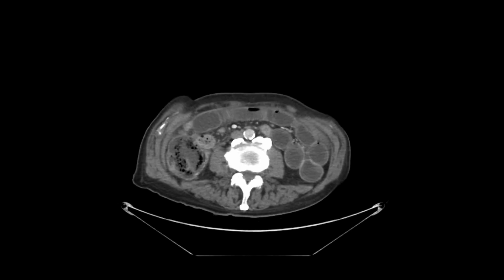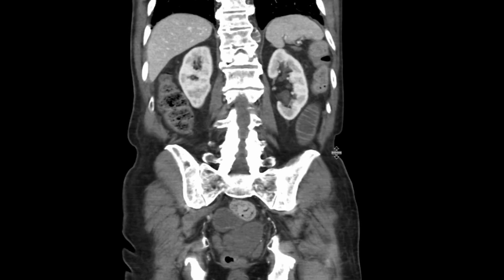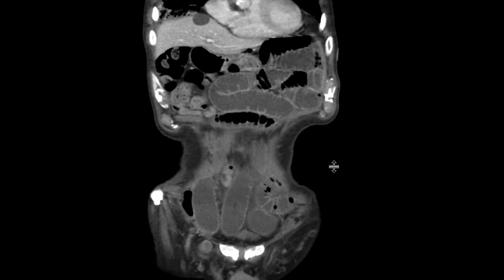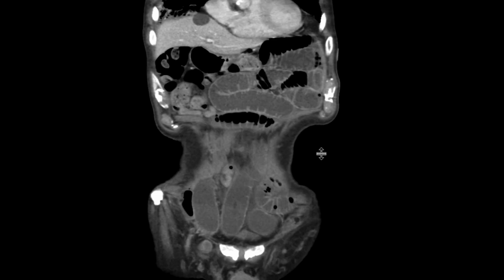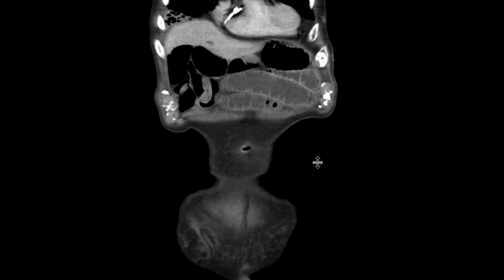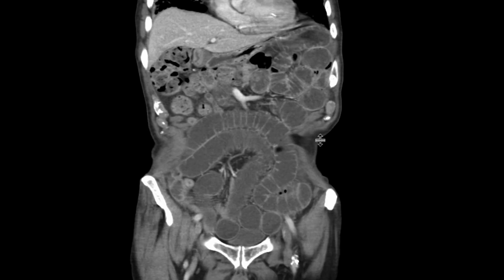small bowel obstruction due to a right-sided femoral hernia, we can see some of these findings very nicely on the coronal CT scan of this patient. Multiple distended loops of small bowel, and if you look in the right lower quadrant, you can see that abrupt narrowing right at that femoral hernia, beyond which, when the loops of bowel go upwards again, the loops are collapsed. And so this is a nice example of a small bowel obstruction due to a right lower quadrant femoral hernia.